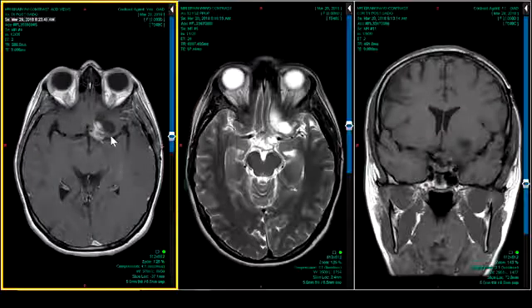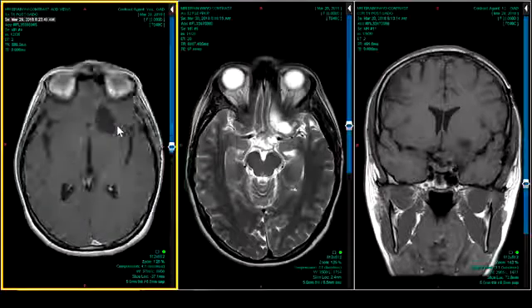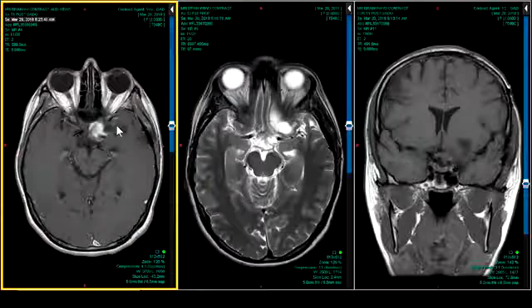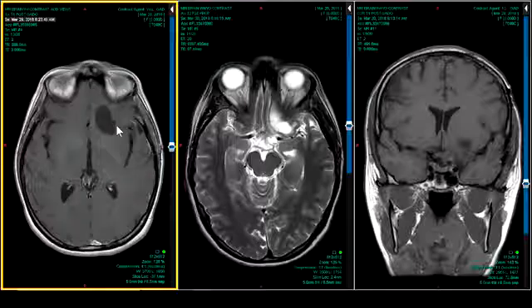Another lesion that can make a cyst and nodules is the parenchymal supratentorial ependymoma. Most people think of ependymomas as being intraventricular, but not infrequently they are parenchymal due to ectopic tissue in the brain. So they can make nodules and cysts. So that would be an interesting and important differential diagnosis because those are potentially fatal lesions, and pilocytic tumors are potentially curable lesions. They have a pretty good prognosis. Any other nodular cystic lesions that you would consider in the differential diagnosis? I'm not sure there are too many others.